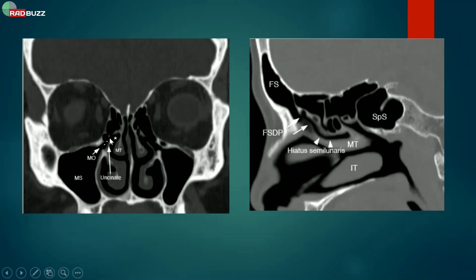On this section, we can just see this one because that's the anterior ethmoid sinus here. That's the draining part of it into the hiatus semilunaris, and from here the maxillary sinus will drain into this portion, and this static area is the hiatus semilunaris, and it will drain here into the nose, into the middle meatus.